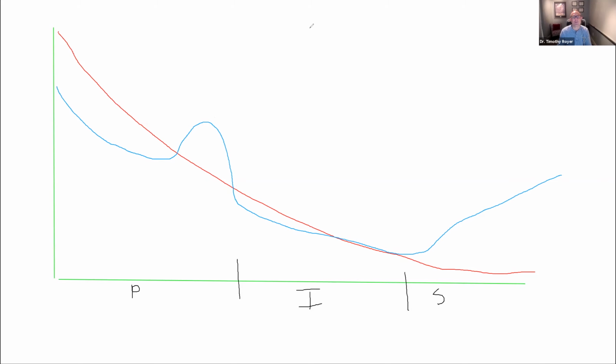Many times, and this isn't just marijuana use, it's other substances too, but particularly for marijuana, the presenting issue is typically this right here: those fast frequencies are dominating the brainwave.